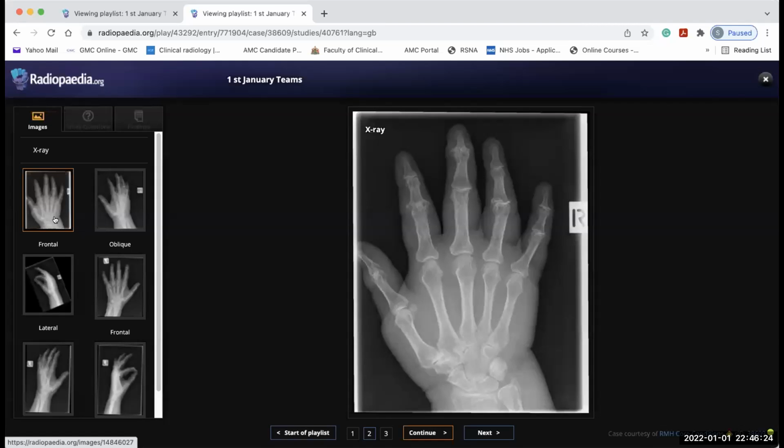Great. So any other differential diagnosis? Actually, this patient presented with morning pain and stiffness, so based on the clinical presentation, it can be rheumatoid arthritis. Correct. But rheumatoid will have periarticular osteopenia and no new bone formation. Great. Move to the next case.